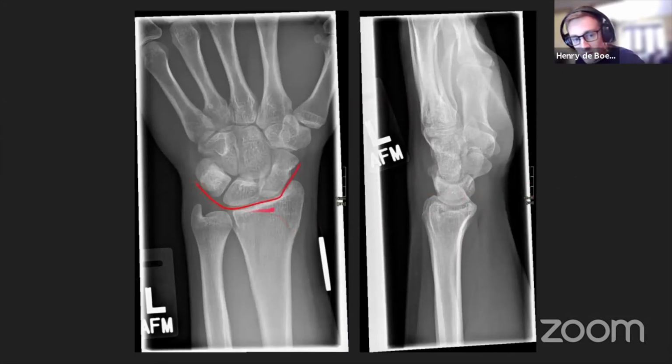And then again, so here is the proximal carpal joint. And when we look at the wrist and the carpal bones, these joint spaces should be uniform, and they should be equal throughout all the joints. So you should see these nice joint spaces being pretty even and uniform the whole way around. And we call this sort of seeing the light, or the light of day sign.